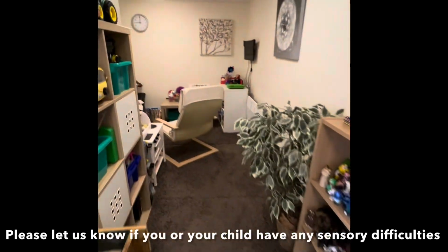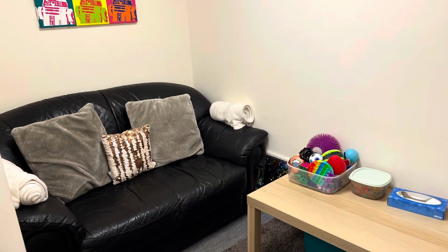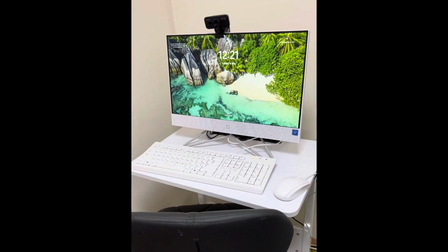Let's have a quick look inside the room. There's lots of toys and fidgets to help you feel more relaxed, and this is where you will sit with your parents or caregivers as I explain the process.